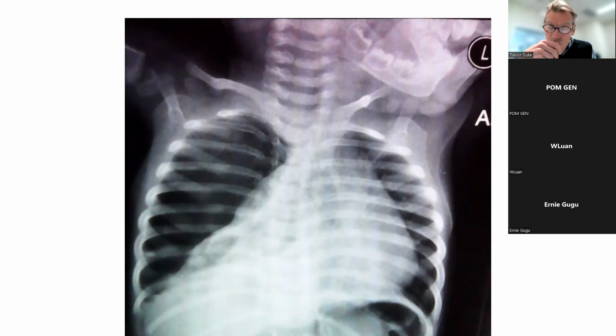Yes, well, that's a good thought as to whether or not there's a pneumothorax in the right lung above the area of collapse. But what's the other thing that you see when you look at the X-ray? Do you think it's a well-centered film, or it might be a bit rotated?